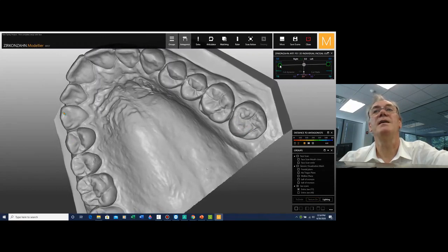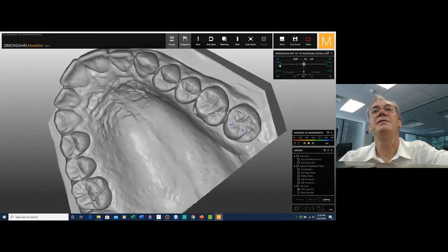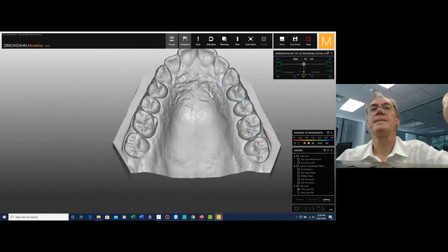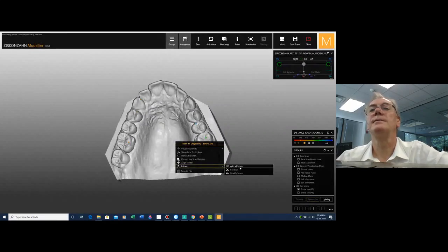So basically what we've done here, we have increased the problem. Now we have to find a solution. And the solution is the same. We carry on working on that contact. Extras. Modify.